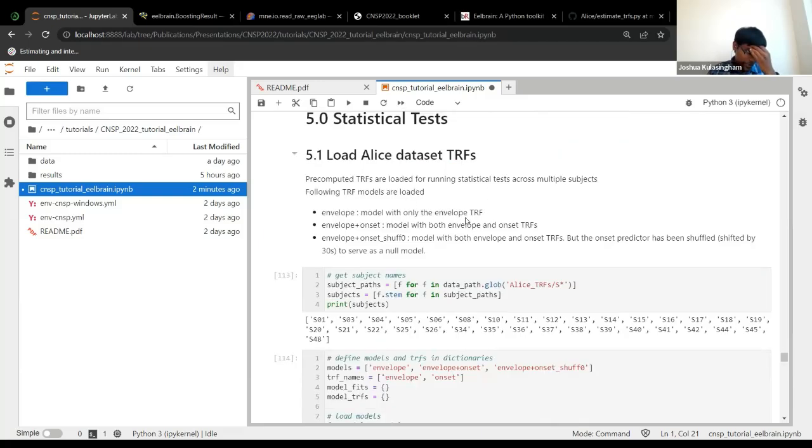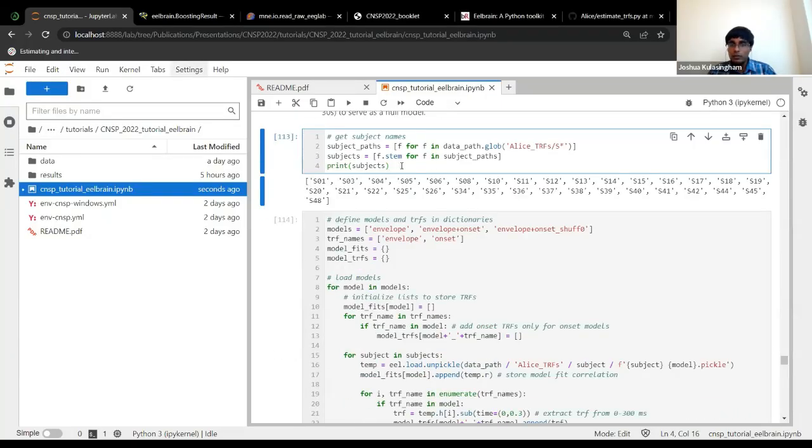I think the way that Eelbrain contributes to this whole thing, because there are so many packages doing statistical tests in different languages, is by having some cluster-based statistics. MNE also has some cluster-based statistics. So if you want to actually test significant sensors or significance in the TRF, then Eelbrain can do that using permutation tests with clustering. I think that's where it's the most useful to use Eelbrain, and it just does it on the ND variables directly.